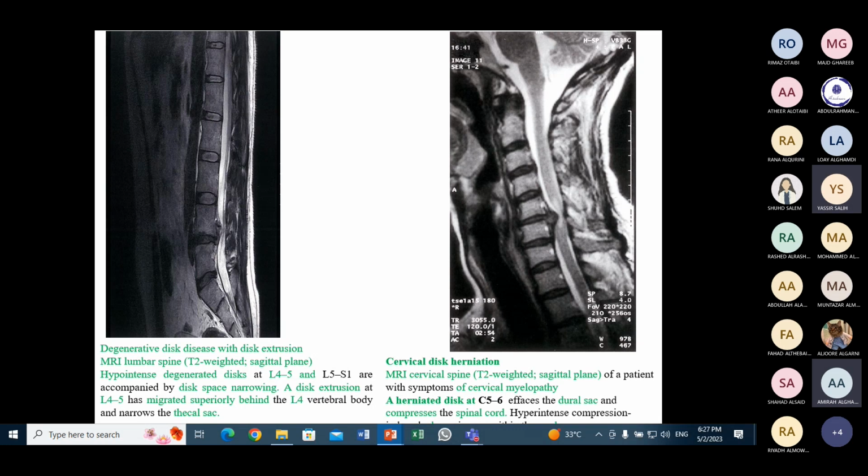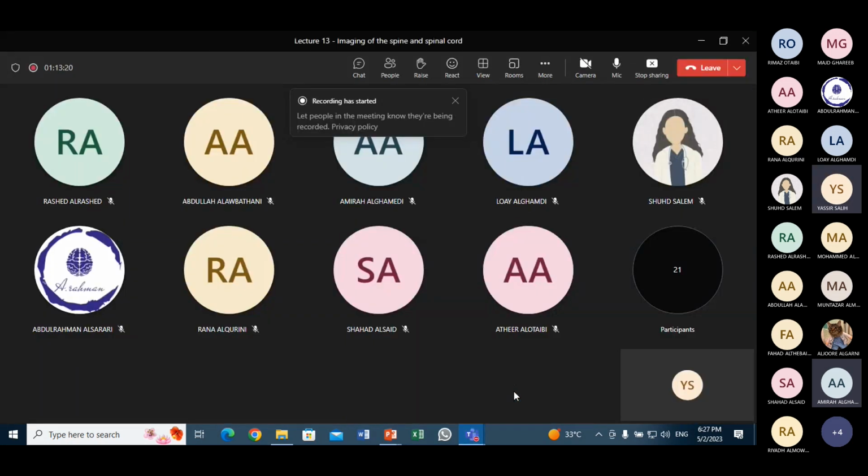We explained before, look at the normal MRI for the lumbar spine T2. Remember we told you the normal appearance of this, what is this? Disc. Is this one normal? No. What abnormality do you see? It's hypointense. Yes, it is hypointense.